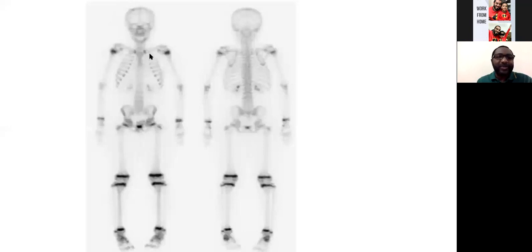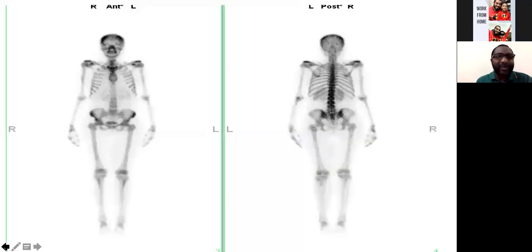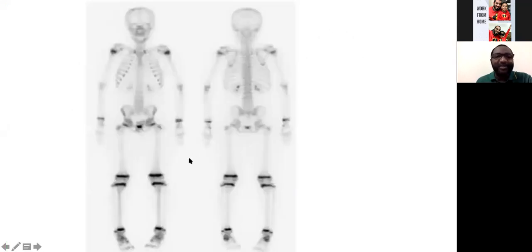The second thing to do is to say that this is a whole body, because we are imaging the whole body in anterior and posterior projection. And you can add by saying that this is a pediatric patient. This is demonstrated by the presence of the growth plate, unlike the one in the adult that we see here that has no growth plate. Sometimes you can see degenerative changes in elderly patients, which is a benign finding that you don't see in pediatric patients.